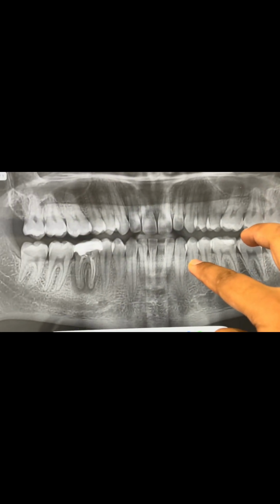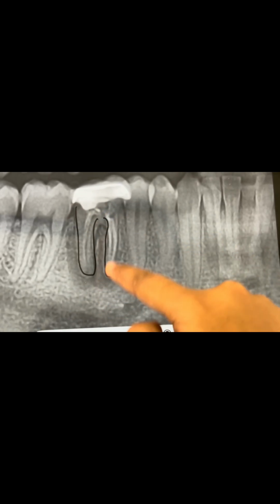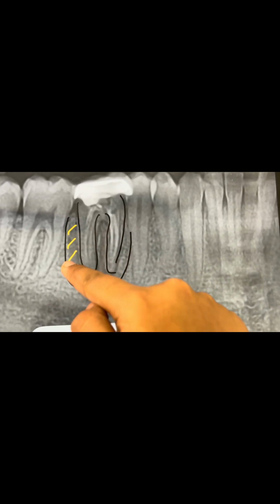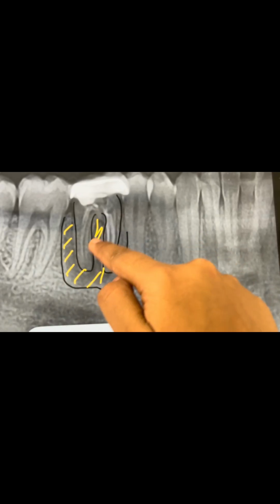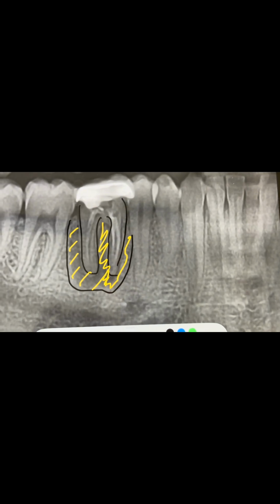And on the opposite side, the major finding over here is that there was an old root canal treatment that was done for the patient, and there is a big apical radiolucency that has involved completely all of the periapical bone, the periodontal ligament, and this shadow is completely taking over the furcation level as well.